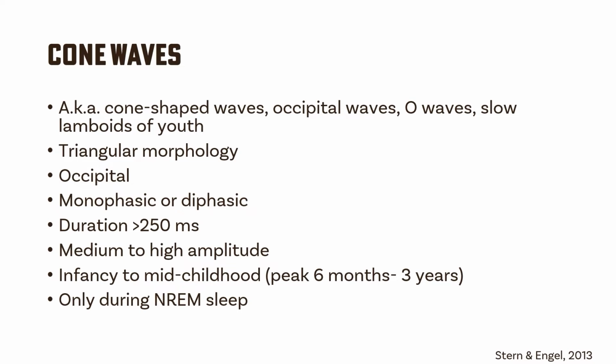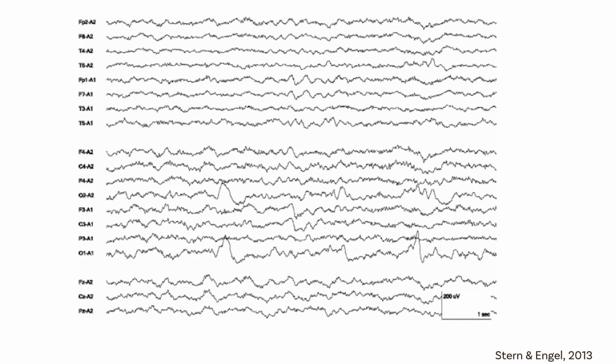So that could potentially help you to rule it out as something that's abnormal. You will not see it in wakefulness. It will be exclusive to non-REM sleep. Here's another example of cone waves.